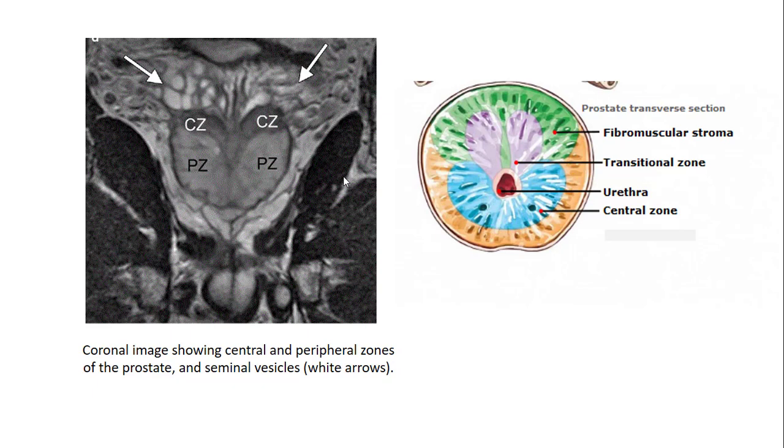Sometimes that endorectal coil would be so bright with the signal that they would not be able to get good images because of the different gradients of signal. It was so intense right next to the coil and then not as intense as you went out further away from the coil towards the bladder, that it was almost distracting to try to view the images and get a good sense of what you were looking at. But those have gotten more advanced, as have the MRI scanners themselves, and they're able to get great images with both techniques.